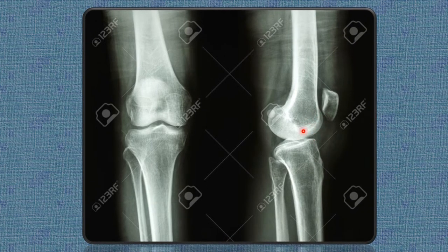This is the lateral view. This is the anterior view. This is the patella, and in this lateral view you can see the patella, base, apex. This is the patellar ligament. What is this? Tibial tuberosity. Medial intercondylar tubercle, lateral intercondylar tubercle. If suppose the fibula is not there, how will you identify which side is medial and which side is lateral? The medial intercondylar tubercle is sort of taller or larger compared to the lateral one. You can even identify it in that way.